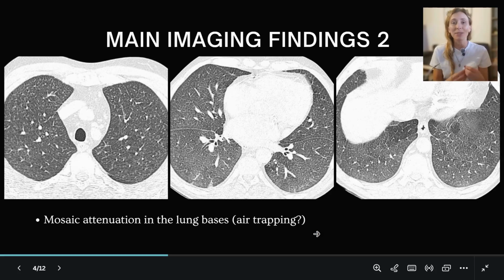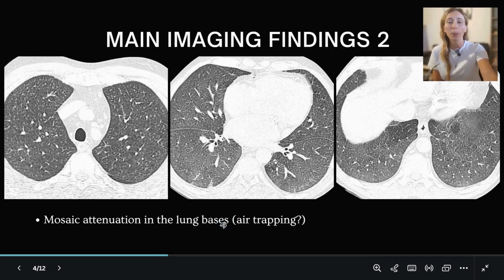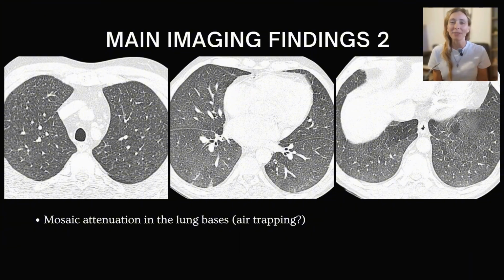As you can see, to describe these images, I'm using helpful phrases or words that are not natural for me because I describe cases in Spanish. So when you are presenting your case, you can use as many words as possible to try to describe the image that you are showing. Just be mindful that images are the key components of your slides. So they should always be bigger and the text should be short.